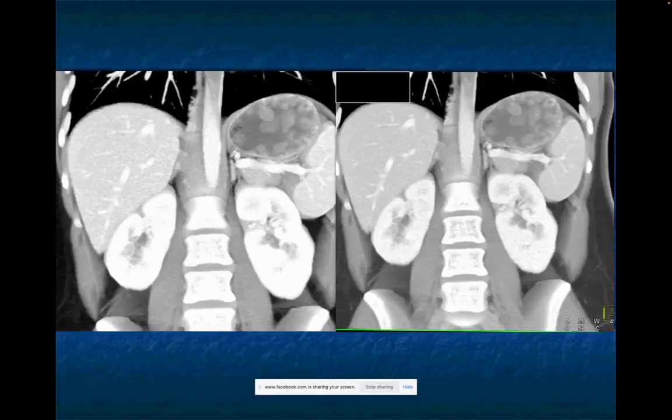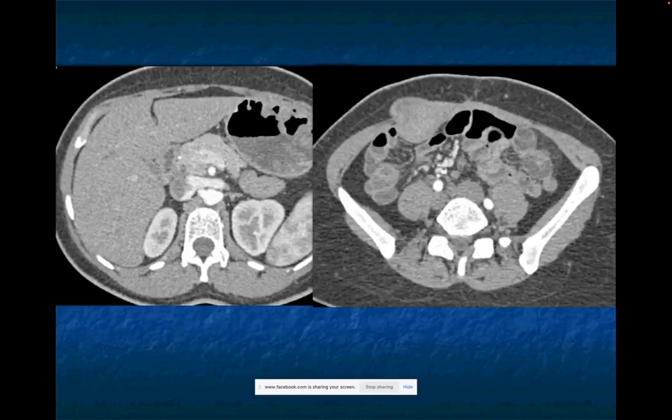Multiple lesions, okay? But I said to you the patient had right lower quadrant pain. There's a mass in the rectus muscle. Now, of course, you could say maybe the patient has gastric cancer and has a muscle met. But if I put it together, multiple polypoid lesions in the stomach, think polyposis. Think a mass in the abdominal wall. In the right history, it would have been endometriosis, could be metastasis.